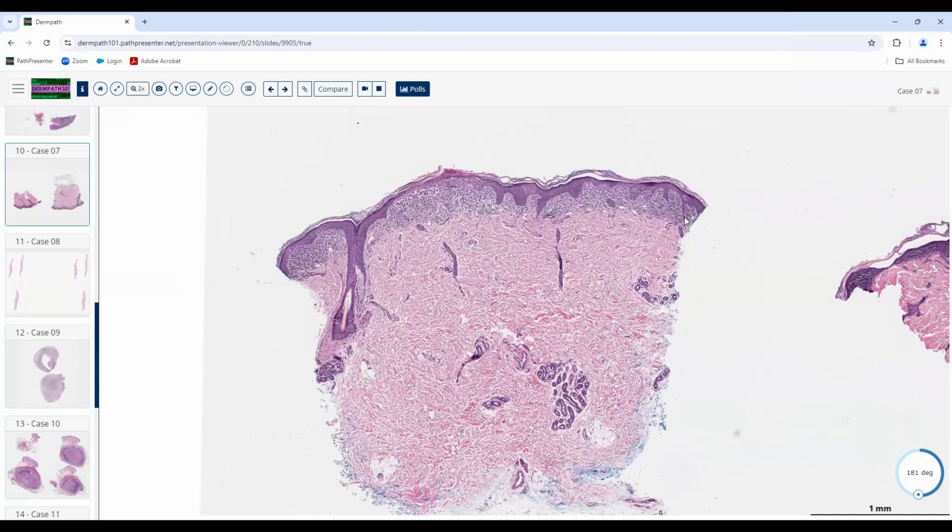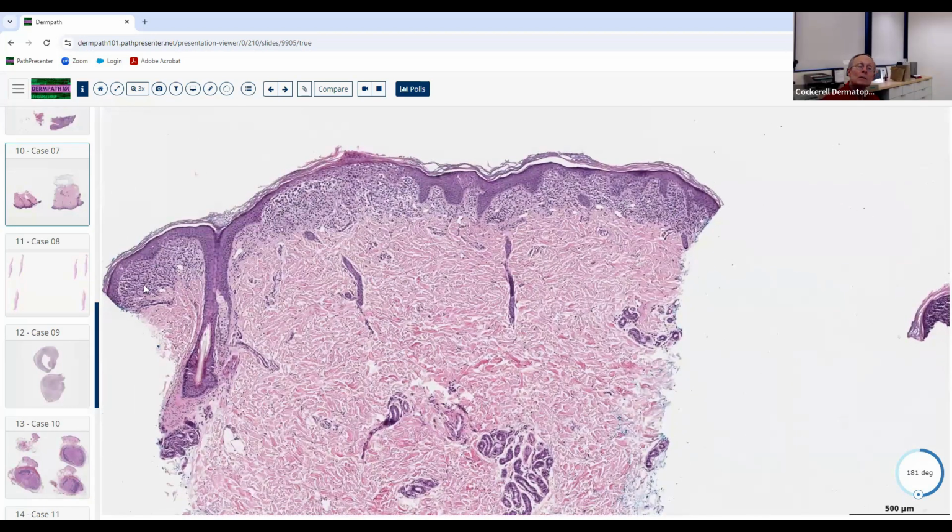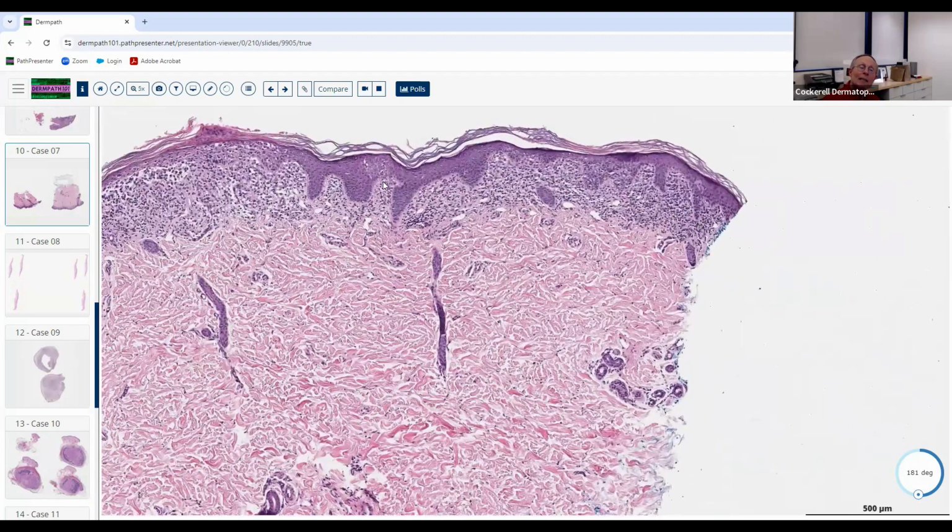Yeah. You don't think so, LP? We're going to say it's lichenoid, but it's not lymphocytes, so we're going to say it's not lichen planus. Okay. So that narrows our differential quite a bit, doesn't it? Yes. So what kind of cell? You said these may be histiocytes here. I think so. I see some eos as well when I zoomed in. Those two, good. So we're talking about a lichenoid histiocytic pattern mostly, or some cells that look like histiocytes mostly. That's a short differential, very short.